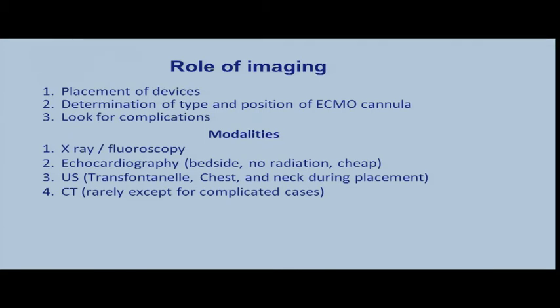Transfontanel ultrasound has been of use in monitoring neonates that are placed on ECMO, because you will see later on one of the complications that can arise from ECMO management is hemorrhage. So these kids can actually have intracranial hemorrhage. So they normally try to check their transfontanel before and after placement.